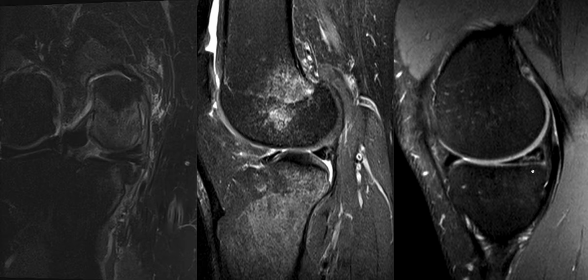In this case, the horizontal tear is extending into zone 1, but is not completely penetrating the periphery of the meniscus. When these tears do penetrate the periphery, they can be associated with meniscal cysts. This is a common tear pattern in older patients and is not always symptomatic.